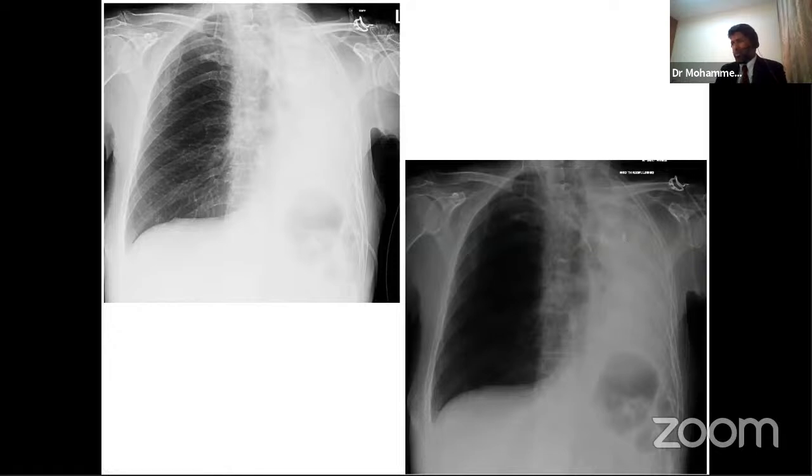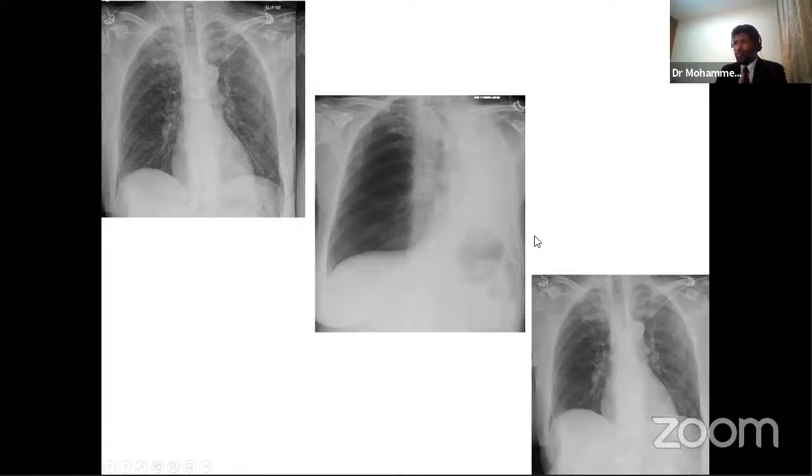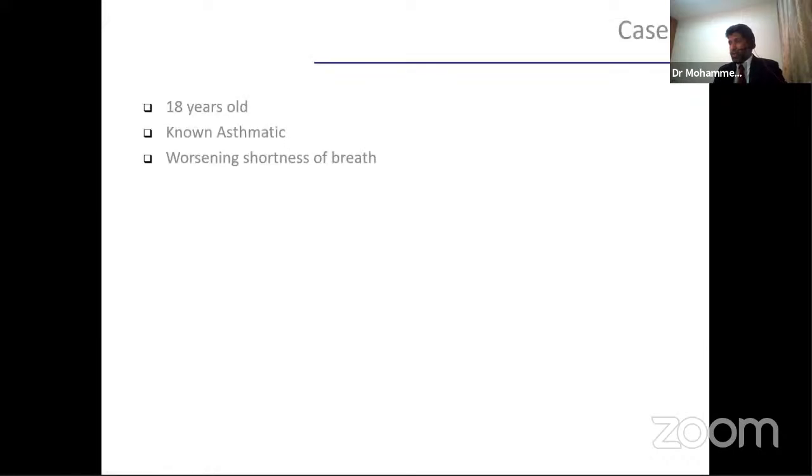What could it be? It could be one of many things. I think we just need to look out for the good old friend, the most recent chest X-ray. We can see the central line there, and this was day 2 of admission to critical care when the patient had completely collapsed the left lung. This was most likely because of mucus plugging. We did the bronch, cleared the secretions from the airways, and this was straight after clearing the mucus plugging within the left main bronchus.